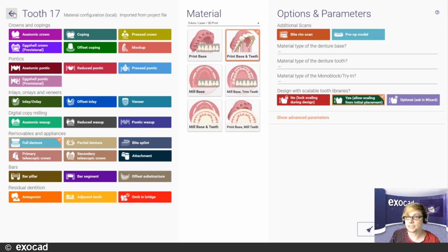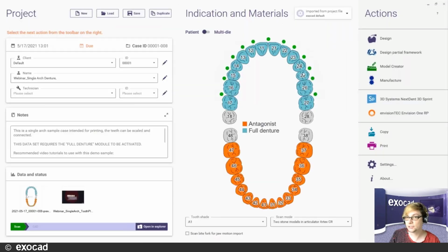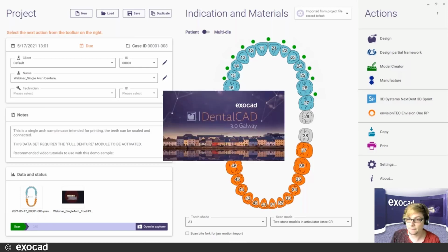Also interesting is that we can actually select connectors here for our tooth arch, meaning that in the end we get one piece of a tooth arch where all of the teeth are connected, that we can print as one piece and just stick into the base and glue them together with the fitting acrylics that work with the material that I used to print it, and I'm done.